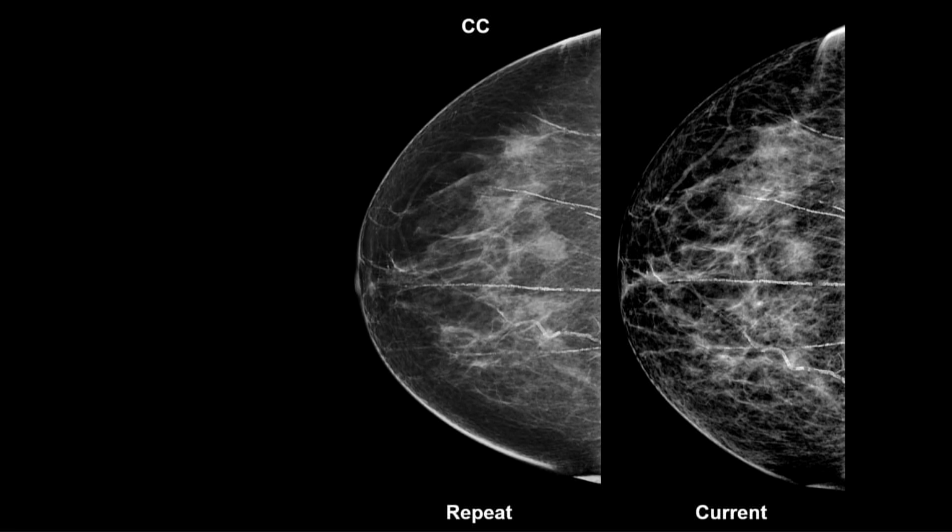This case worked out differently than the previous one because here on the repeat you can see it again. And it looks the same. And what does this suggest? Well, there are two explanations. One is you managed somehow by really bad luck to take a picture of exactly the same as you had before, and it looks like it's real, but it's still really a superimposition. That's highly unlikely, but it's a possibility. The much more likely thing is that it's real.